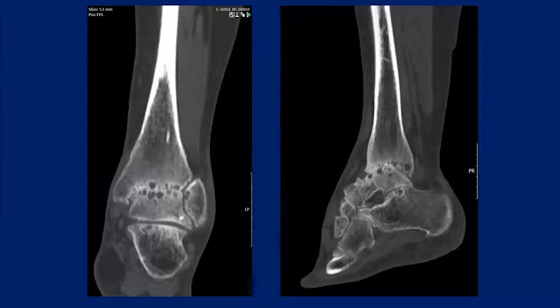Next. Different patient, coronal and sagittal CT images. We can see there's really decreased bone mineralization, right? This is more of an inflammatory type picture. In contrast to the case we just looked at, this is more uniform joint space narrowing throughout the ankle, an overall paucity of bony proliferative changes, and we also have a preponderance of subchondral cystic change. Next.